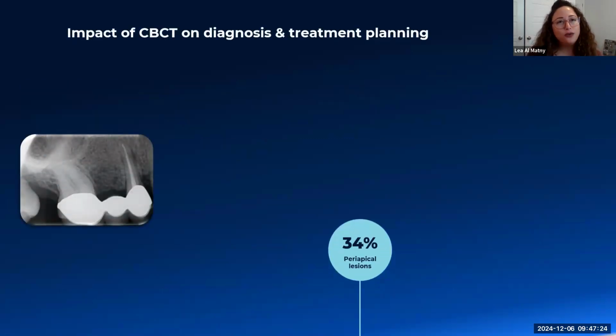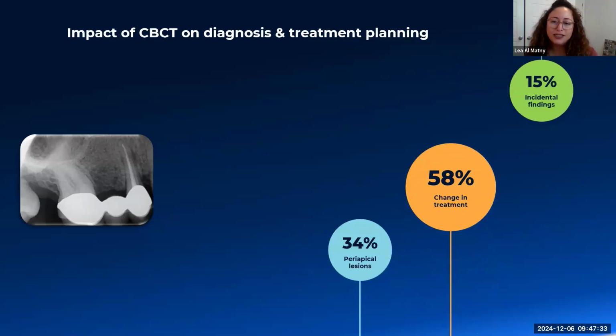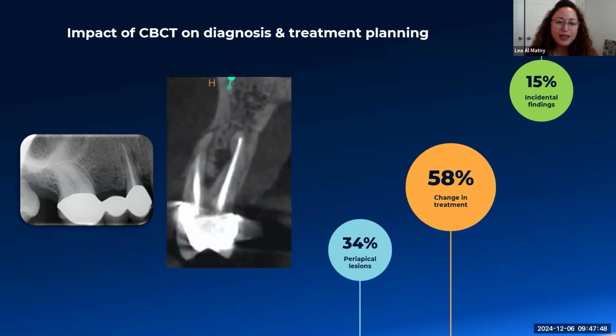Okay, so we finished the cases. I still have one CBCT scan I would like to open the software and look at with you. But just as a summary, I know we just talked about 3 cases, but I would really encourage you to use CBCT scan, whether you have it in your office or not, and to think of it as a diagnostic modality, because a lot of times you'll see that it affects your diagnosis and affects the treatment plan.